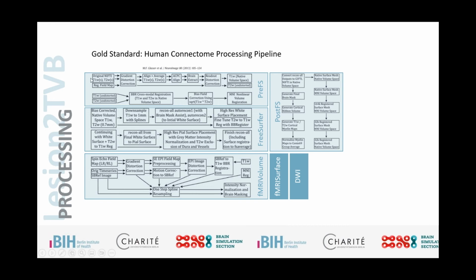So just to give a rough idea of what is happening, we're starting with our original T1 and T2 images with the corresponding field maps, which are actually not even necessary if you're talking about the minimum requirements.